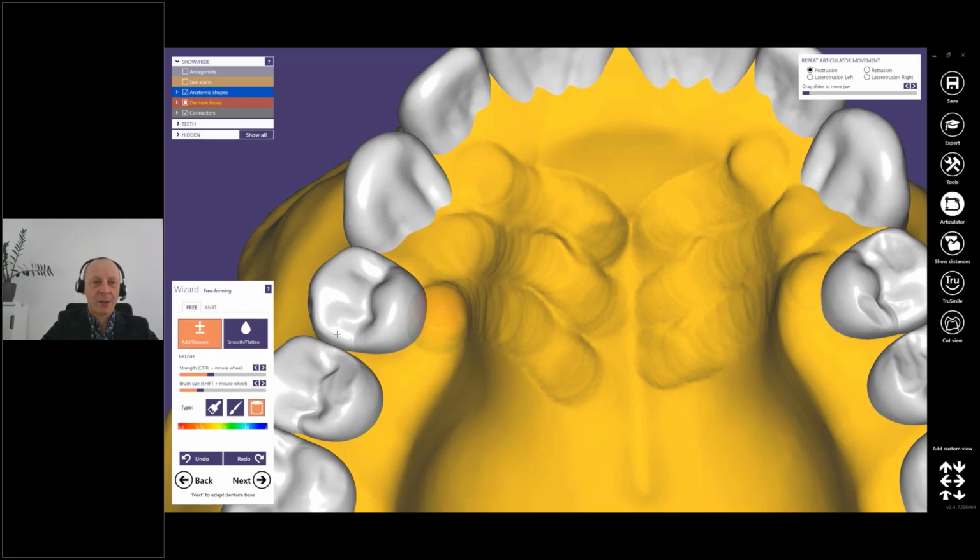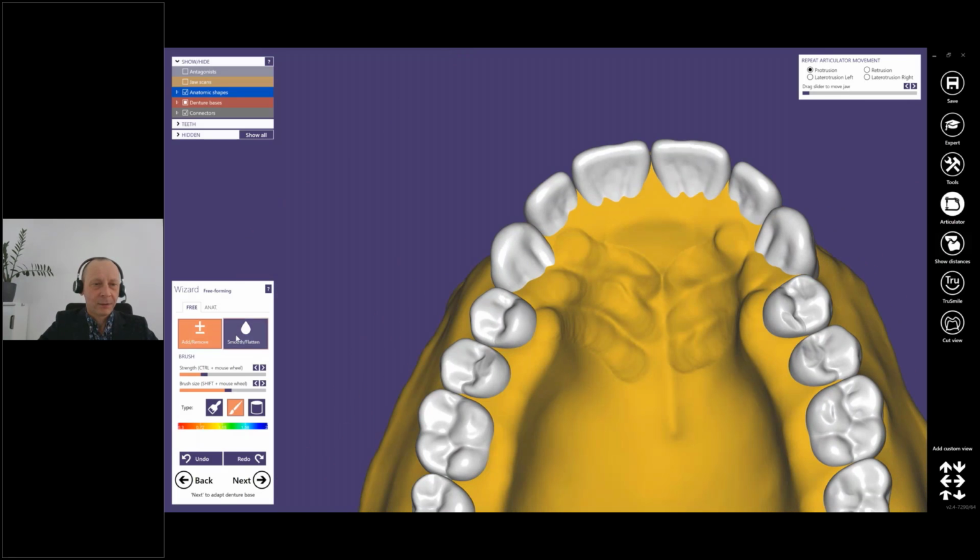And what you can do, you can scratch in between this point of knife here. And in the end, it's probably a good idea to smooth all this structure a little bit.